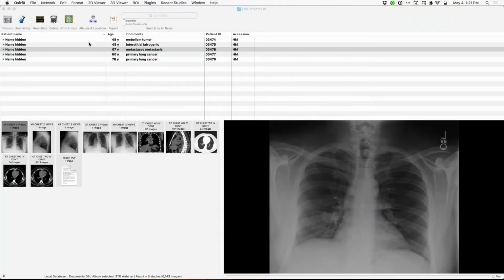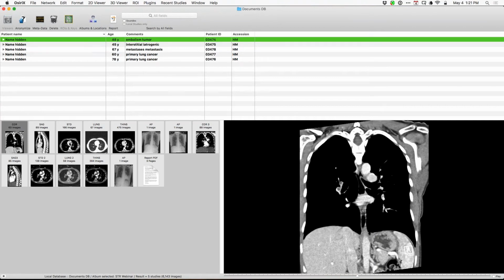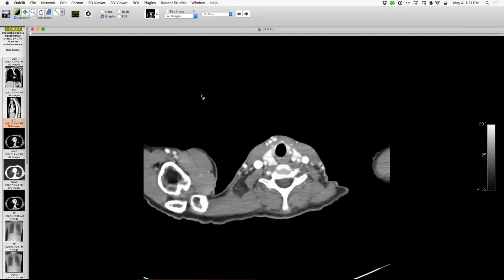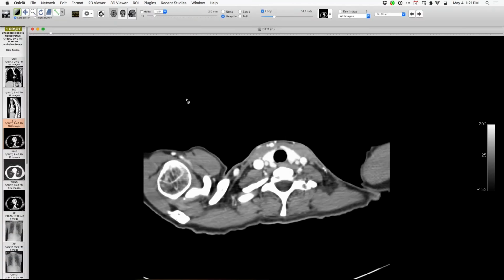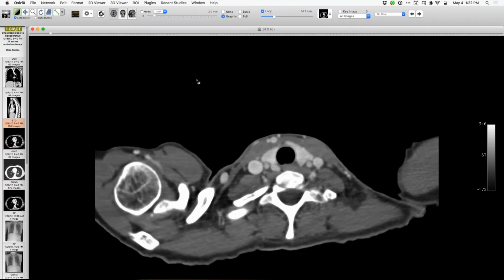All right, let's take a look at this one first. I will tell you that when this person came in, she was diagnosed with PE. And let me just scroll through it without any comment.